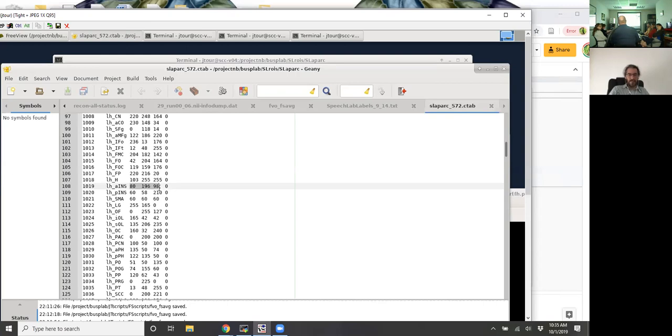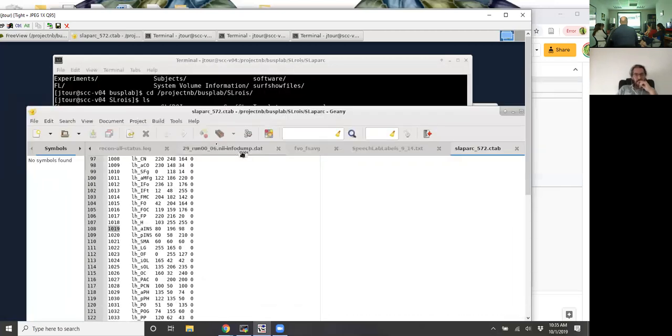So when you do that, you then label that volume, but what you're doing is you're moving both ROIs from the left and the right into that same volume. So Freesurfer knows how to take the embedded color table and that annotation file, and then map that to one of the ROIs in here. And then it generates the labeled volume, and it gives that labeled volume these indices. And let's test this, if I'm telling you the truth, or I'm just making this up.